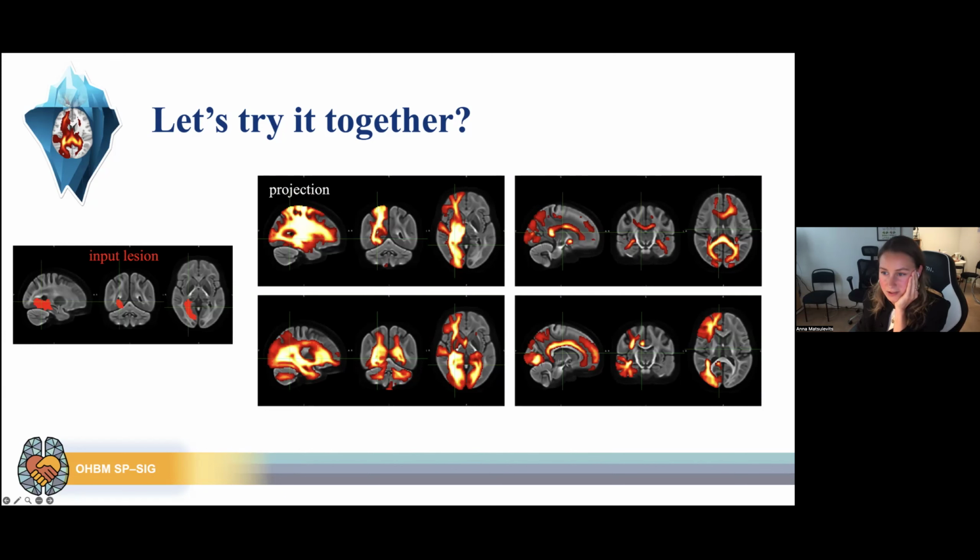So we have fibers going from one hemisphere to another. So these are maybe, the chat, I can't open the chat. Maybe commissural fibers. Very good. If somebody guessed it in the chat, I'm proud of you. Okay, the third one, this looks like it captures a lot. It captures kind of all the connections, all the stuff that there is. Of course, it's a whole brain model. And then we got the last one, which is the association fiber model.